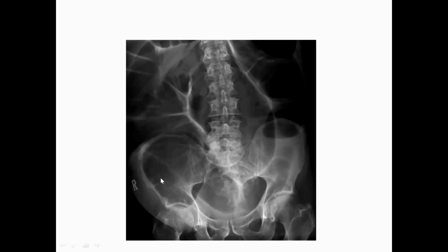So it's in the left iliac fossa. If you look at here, the proximal part of the large bowel has also been dilated here, and even in here also. How can I trace it? Is there any way I can trace it? So the sigmoid colon is hugely dilated here, and if you see here also, adjacent to it, there's a proximal dilated large bowel also here. So this case has been obstructed or twisted at the mesentery, which caused sigmoid volvulus.